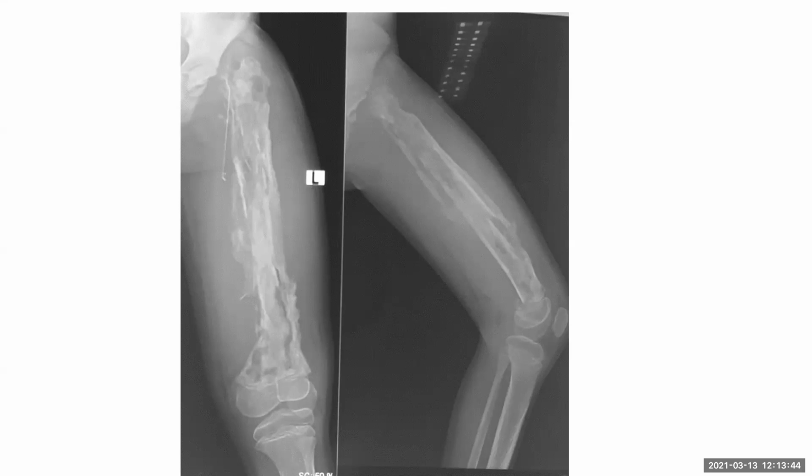Anything else you could do for this patient? I think if we are considering myositis ossificans, and if the clinician with the discussion needs it, we can do a CT maybe to reconfirm. But however, comparison with the previous and the clinical history, I think it should suffice. Okay.